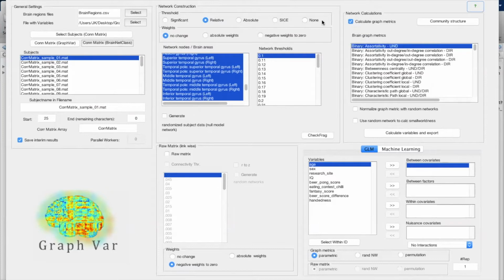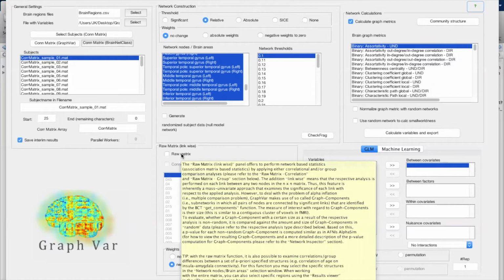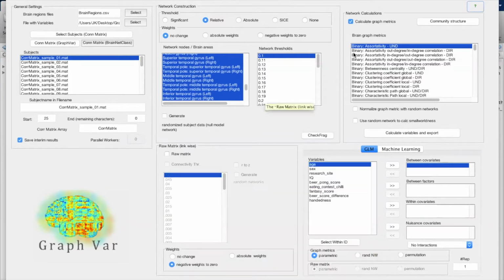If you hover over those functions, it will show you what is actually meant by this. And most importantly, for some, you will not see any help because those were added in later versions of the toolbox, and we didn't manage to upload this yet in our help functions, but I'll do this probably in one of the next releases. Okay, so I'll disable this now again.